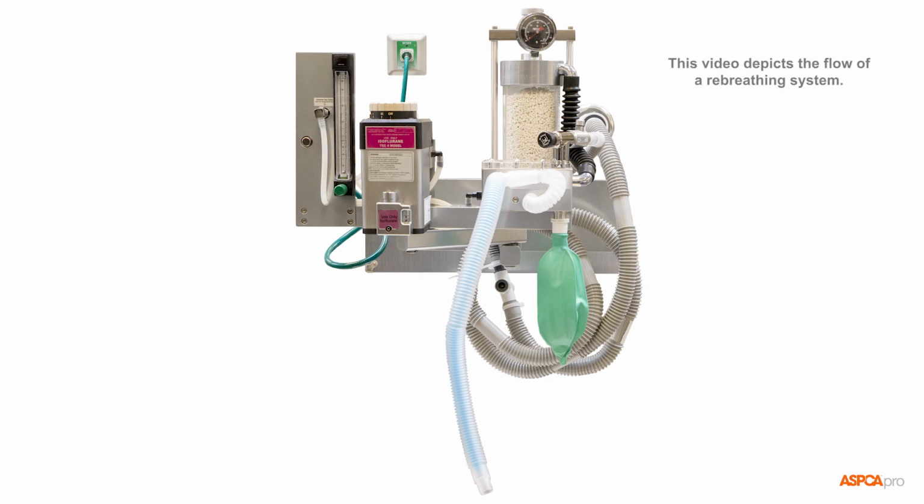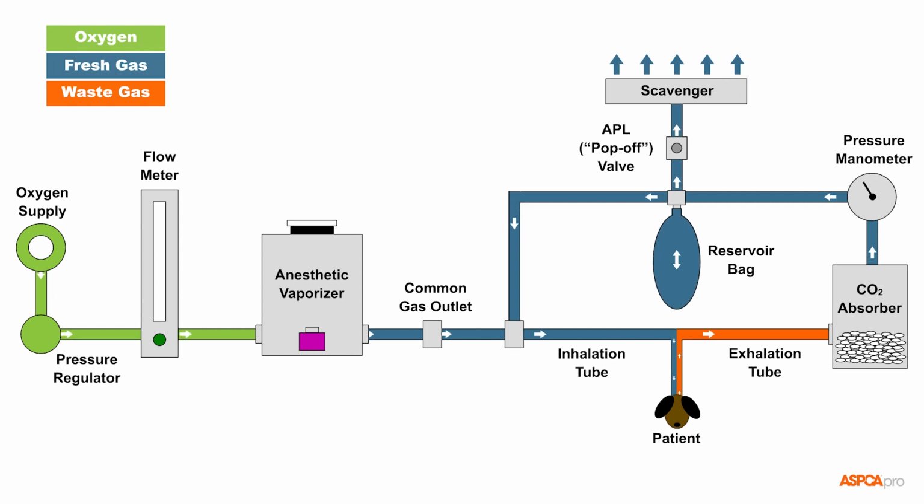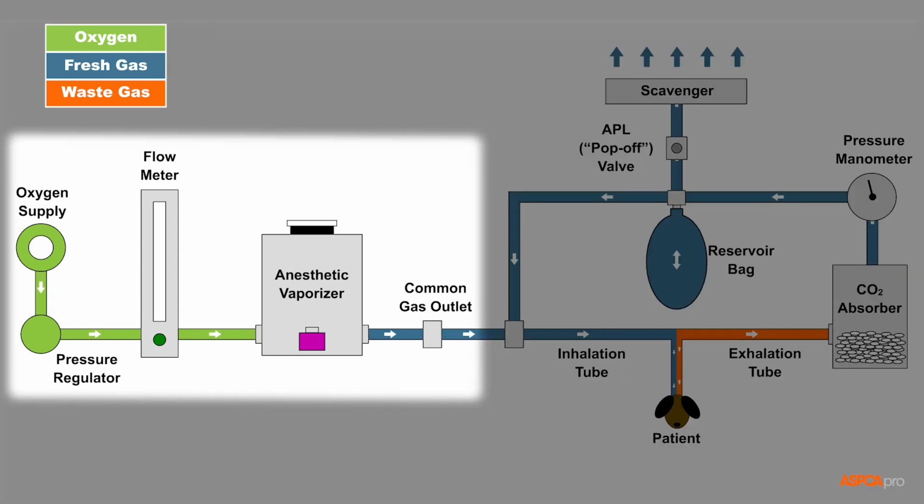Understanding the flow of oxygen through an anesthesia machine and breathing circuit is essential for mastering the system. Full knowledge of the machine will also help keep the patient safe and provide insight while troubleshooting any complications that may arise.